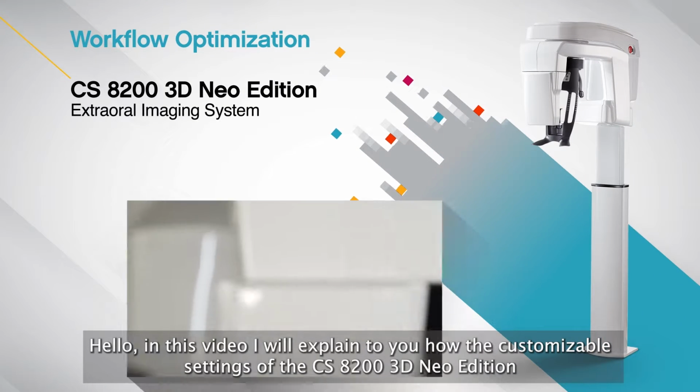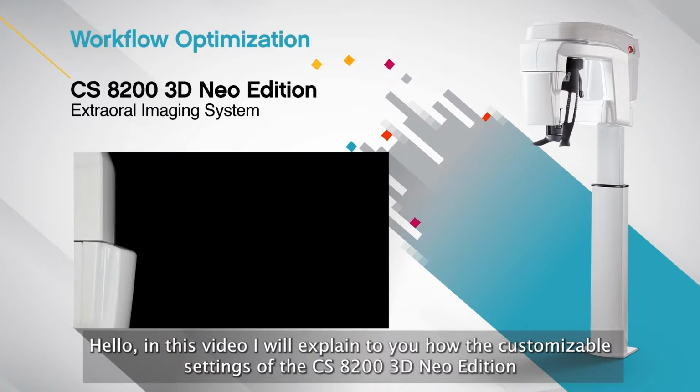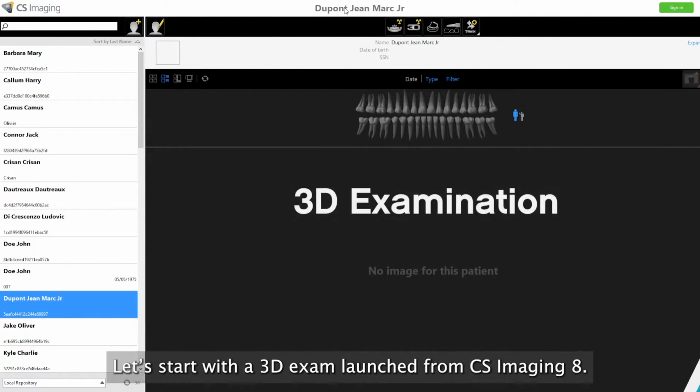Hello. In this video, I will explain to you how the customizable settings of the CS8200 3D Neo Edition can help you to optimize your acquisition workflow. Let's start with a 3D exam launched from CS Imaging 8.